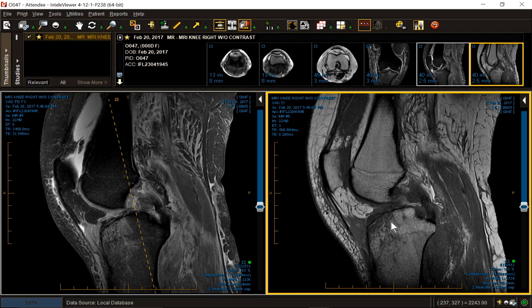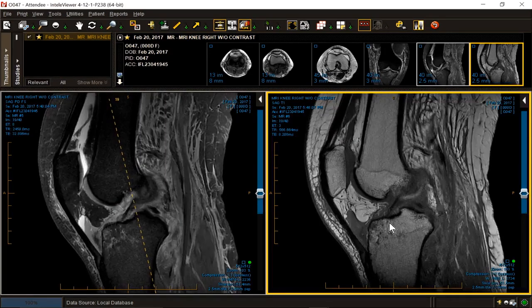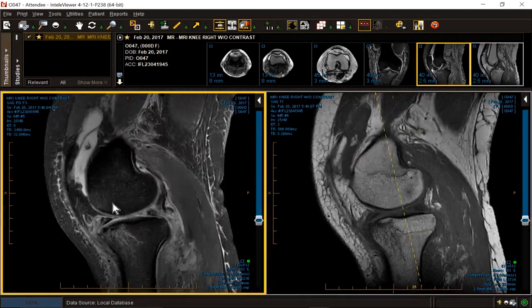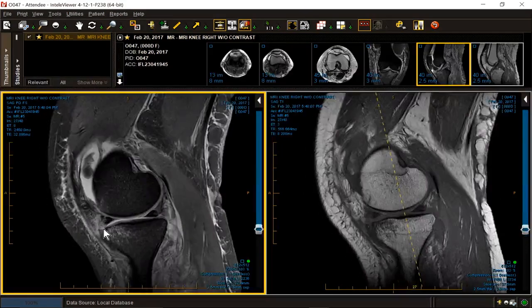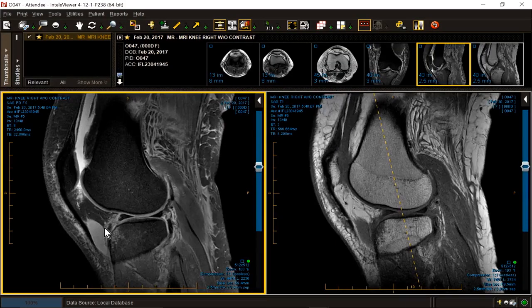There is a high-grade microtrabecular fracture. Is there a kissing lesion in the tibia? No. So perhaps with the leg slightly flexed, the patient took blunt trauma from the front and drove the tibia backwards as the mechanism of injury, impaction. Let's keep looking, shall we? Let's go to the posterolateral corner first.